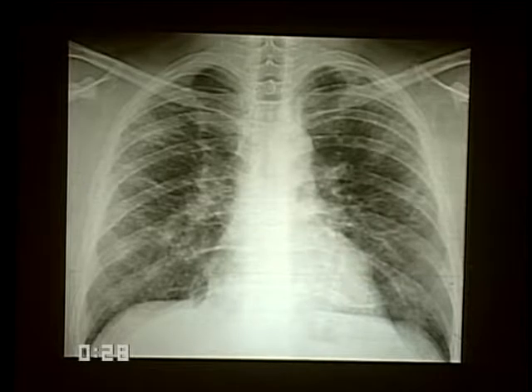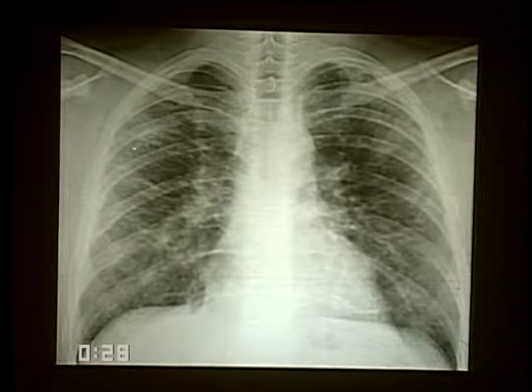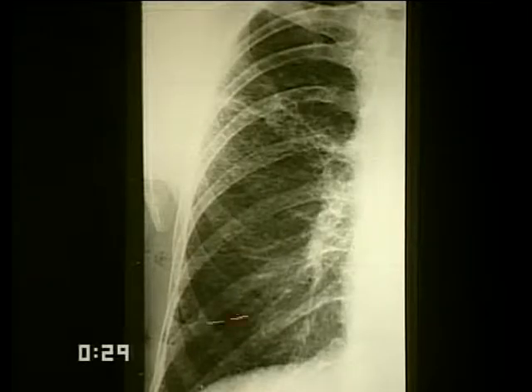Finally, always with interstitial disease in the upper zones, sarcoid has to be considered. This is an example of sarcoid. And the last case I will show is an individual who has a mild and non-specific interstitial disease, which turned out to be a non-specific interstitial fibrosis on biopsy. There is a scar-like abnormality in the upper lobe. This scar-like abnormality is a primary lung cancer.